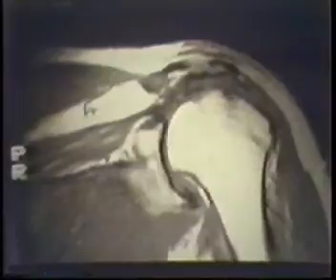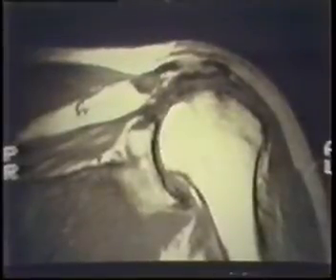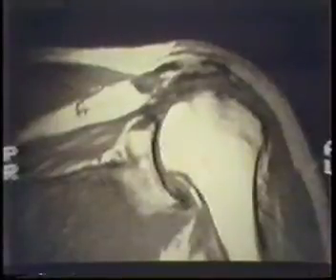Now, what was your thickness? I'm sorry. 5, I like 5s. Why 5 instead of a thinner cut? Notice I like 5 in the knees as well.